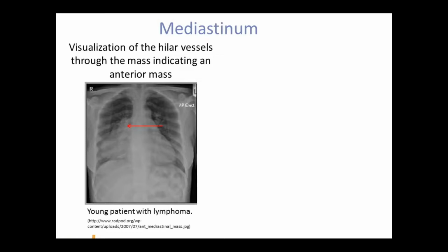With the anterior mediastinum, a mnemonic called the terrible T's can be used to remember the differential diagnosis. The 5 T's consist of thymus tumors, teratoma and germ cell tumors, thyroid tumors, thoracic aorta, and terrible lymphoma. Further investigations done for our patient showed that they had lymphoma.